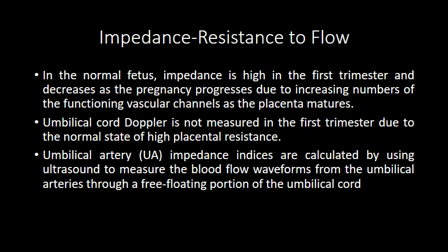Impedance. In the normal fetus, impedance is high in the first trimester and decreases as the pregnancy progresses due to increasing numbers of functioning vascular channels as the placenta matures. Umbilical cord Doppler is not measured in the first trimester due to the normal state of high placental resistance.